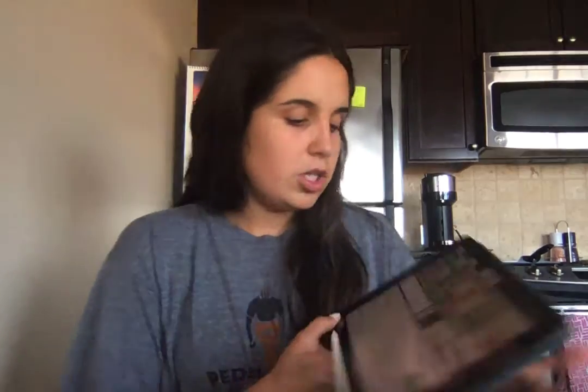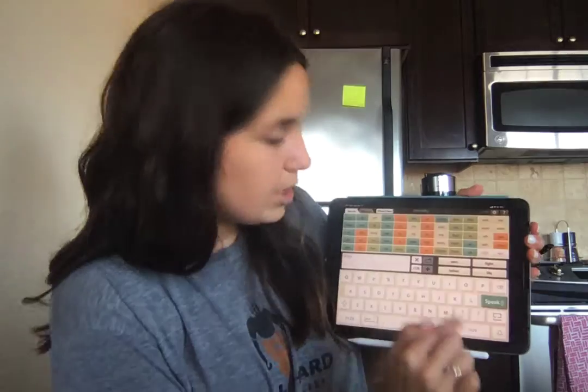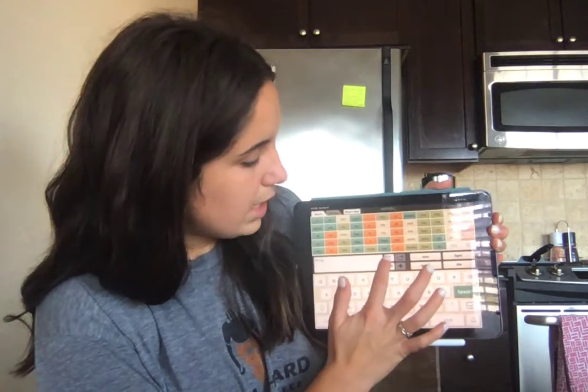So with that being said, my overall impression of Verbally was that it was very easy to use. It was easy to figure out. I think it would be a little bit frustrating to not be able to customize the voice to what you think matches yourself or your loved one, but it was very easy to figure out how to speak it, how to delete all of it. It has this feature, let me type a couple things, where you could delete just the last word that you did, or you could hit this X and delete the whole thing.